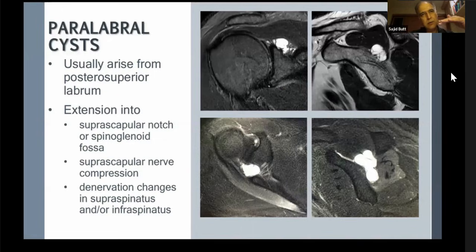And with the passage of time, with the mechanical compression, the meniscal tissue gets extruded and forms a little parameniscal cyst. We were not too impressed about a parameniscal cyst because all it means is that there is a meniscal tear, full stop. In the shoulder, it's the same mechanism. Remember, it is still the same fibrocartilage.